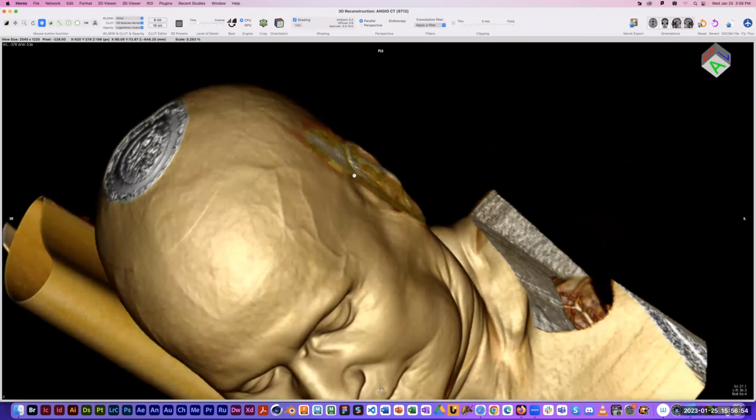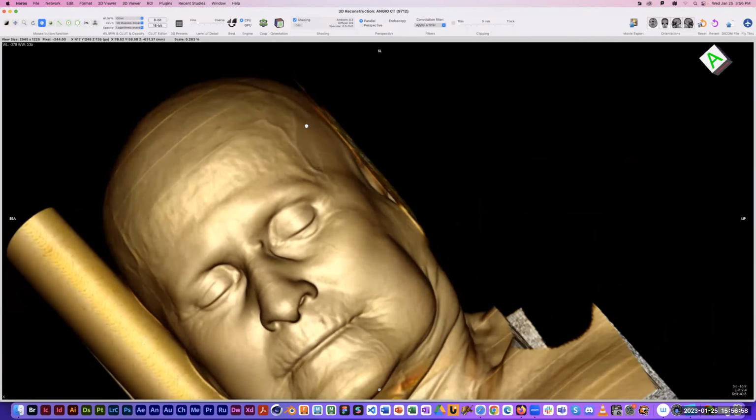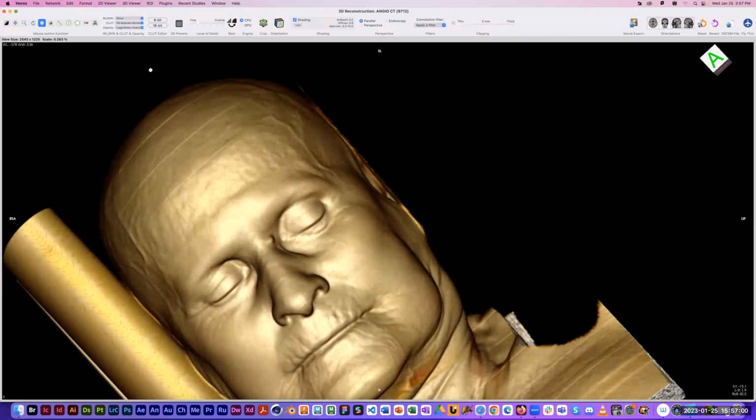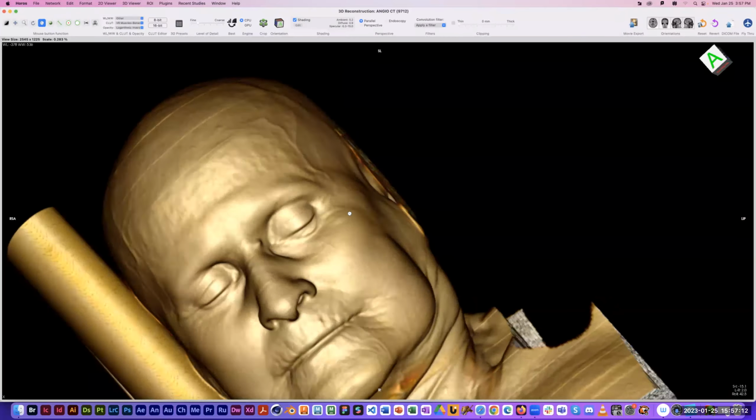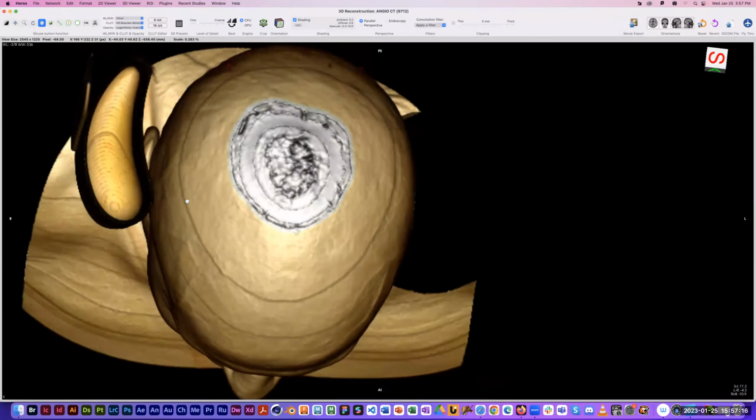So sometimes you have to just reposition it, like this, to try to get more of that off without inadvertently slicing off his shoulder or some other body part. Sometimes you get lucky and there's actually a little space in there.